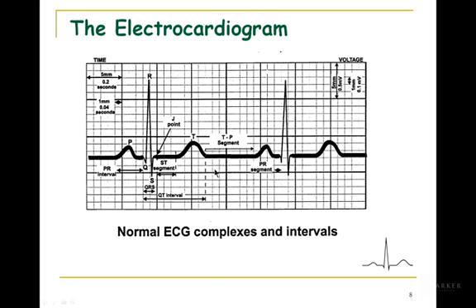When we're looking at the EKG, there are 3 rules to keep in mind. What you're looking at is the average current flowing in the heart at a particular point in time. It's the average. When you look at the P wave, we already know that represents depolarization of the atria, both atria. When you look at the QRS complex, you're looking at depolarization of both ventricles combined.